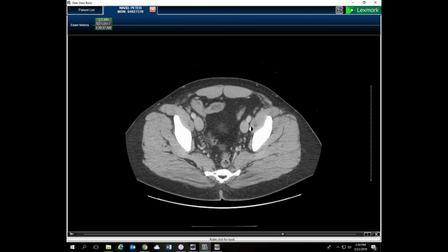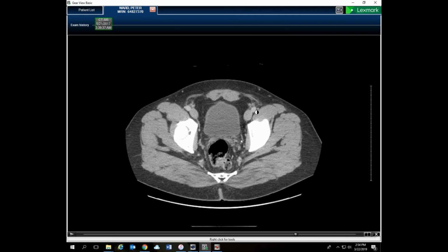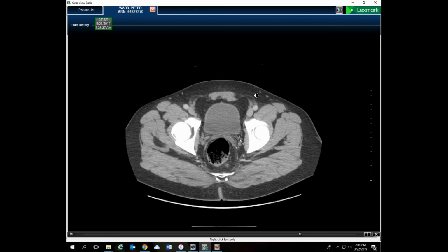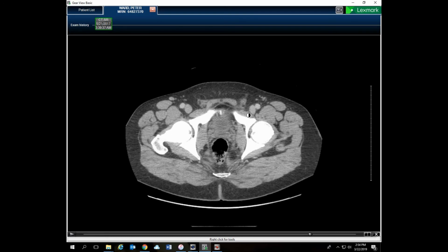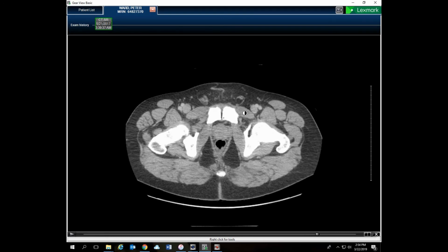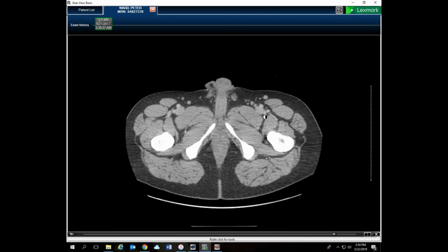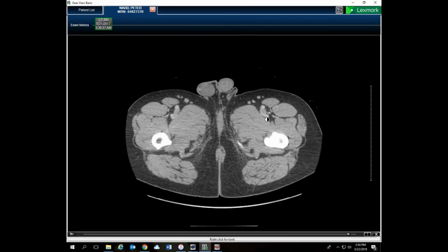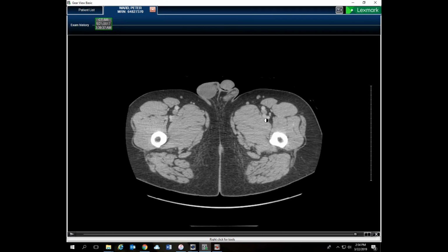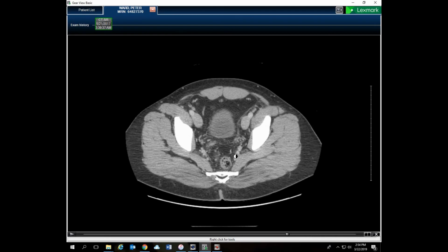and vein. We'll just watch them glide their way through the body wall, cease to be external iliac as soon as they pass under the inguinal ligament right here, and boom, magically become the femoral artery and vein. And then the deep femoral artery will branch off right there, and the remaining femoral artery stays right there, and we run out of scans at that point. So that's the big thing going on with the blood.